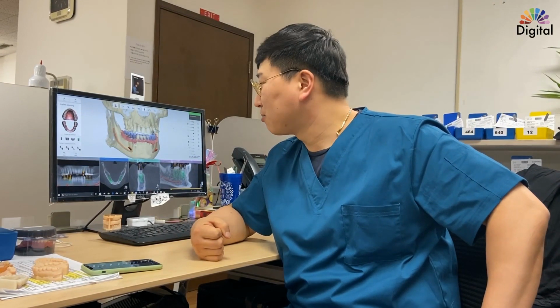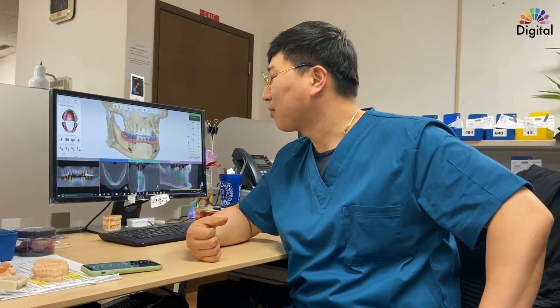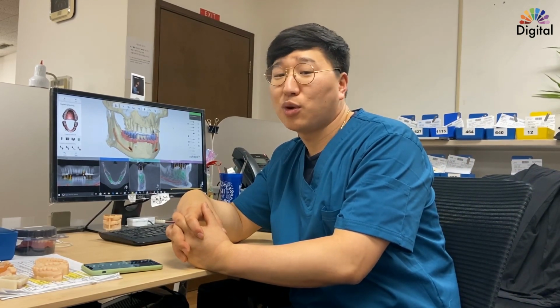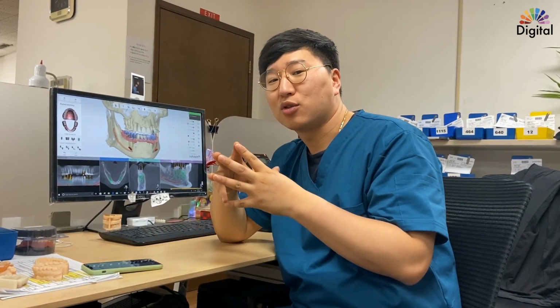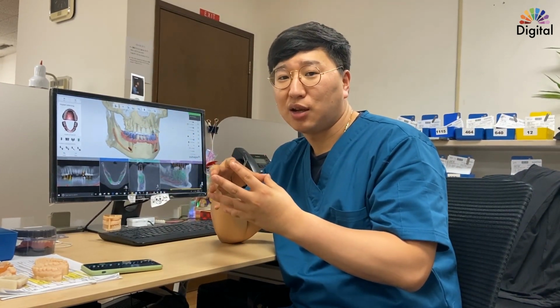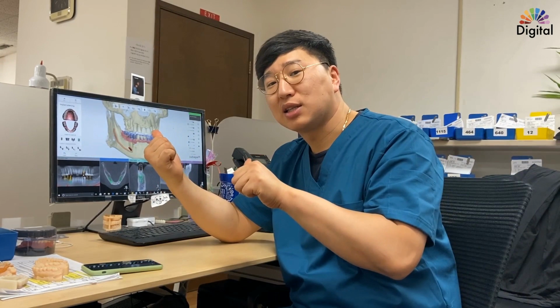I have some fun case today too. I have a surgical guide with the Implant Studio, and then also the doctor wants me to do the digital wax up. Of course, we want to do the digital wax up first, and then combine with the CBCT with the original scan, and we place the implant here.